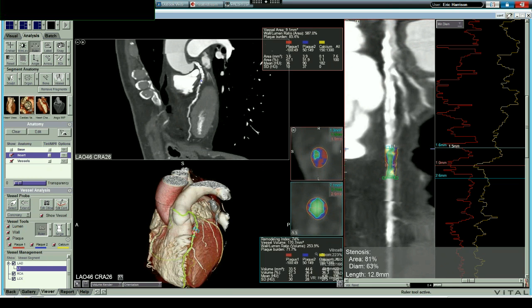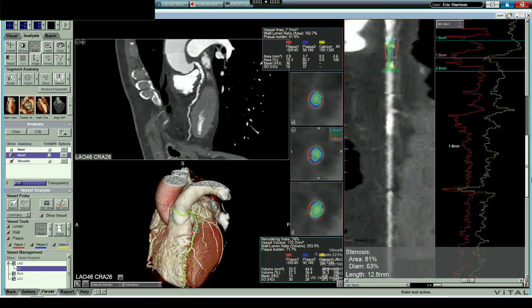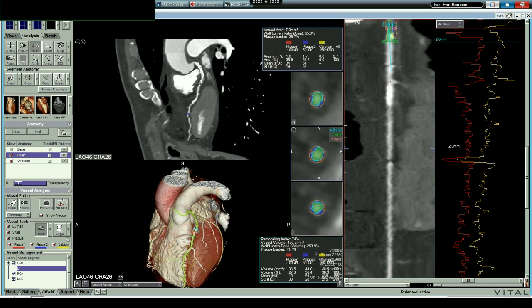And now you can also see how large this distal vessel is, and we can measure that from the plaque, because that tells you something about how much muscle is being subtended here. And if we were going to measure that, put this up here, and we shoot down from there and keep shooting down, and it's pretty long. We got 83.5 subtending, 83.5, and we've only gotten halfway down.